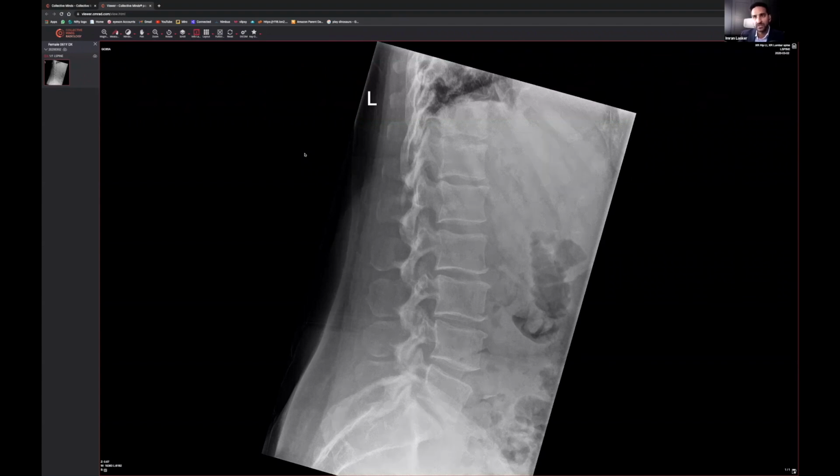But then when you've got a traumatic injury like this, it is important to remember the next few rules I'm going to say. When someone's got a traumatic injury, the way the human body is, if you're going to fall, generally speaking, you're going to have a T12, L1 vertebral fracture. That's more likely than anywhere else, right? It's just the way the human body folds in on itself, or where the impact seems to go. I've always seen it be about T12, L1, L2, that sort of upper lumbar, lower thoracic spine vertebra.